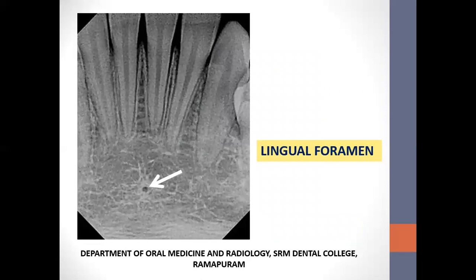The next landmark is the lingual foramen. This is a foramen on the lingual surface of the midline of the mandible in the region of the genial tubercles. There are often two or even more such foramina. The superior foramen contains the neurovascular bundle from the lingual arteries and nerve, whereas the inferior foramen is supplied from the sublingual or the submental arteries and from the mylohyoid nerve.